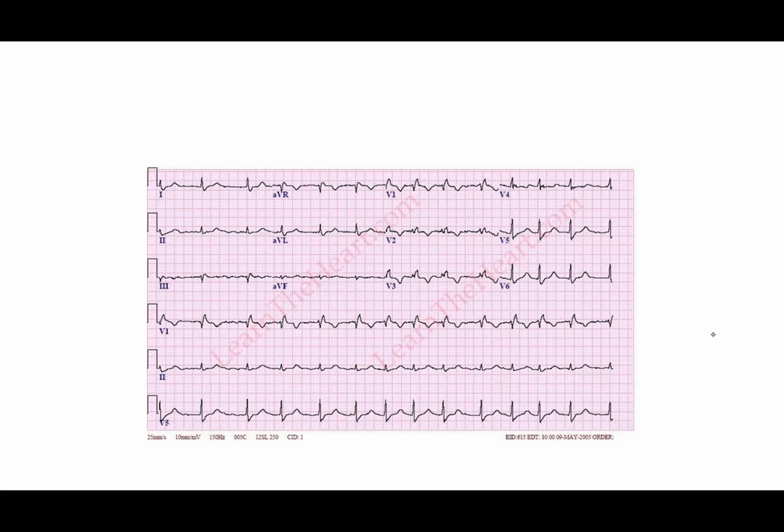So this is a little more tricky, right? So if you look right here, see all that stuff? Those look like fibrillations to me. And then you couple that with an irregular R to R interval. We're going to call that a fib. So it looks like this person is in atrial fibrillation, right?